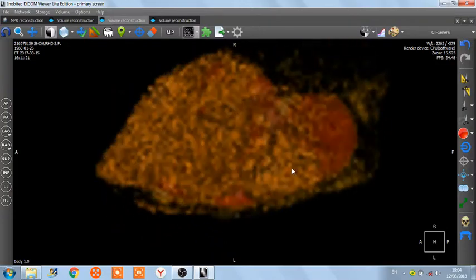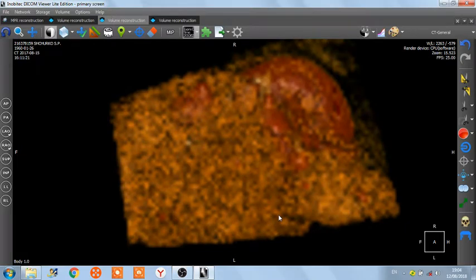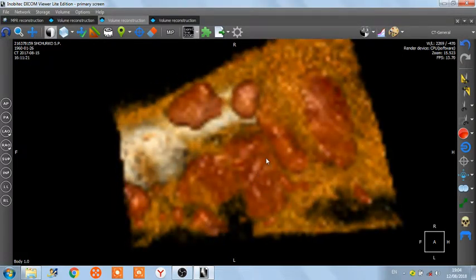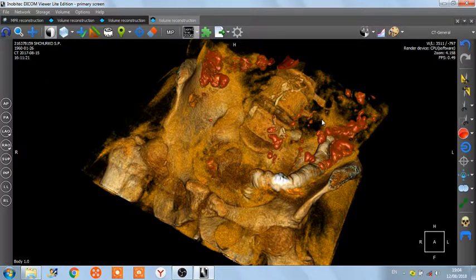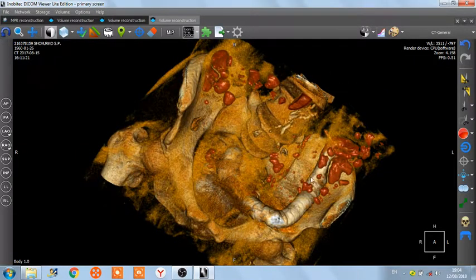I cut those kidney to make a better view with all those small intestines and the big one with the colon. So in 3D it is clearly better than here. We can see what's going on and what happens on those corners here.